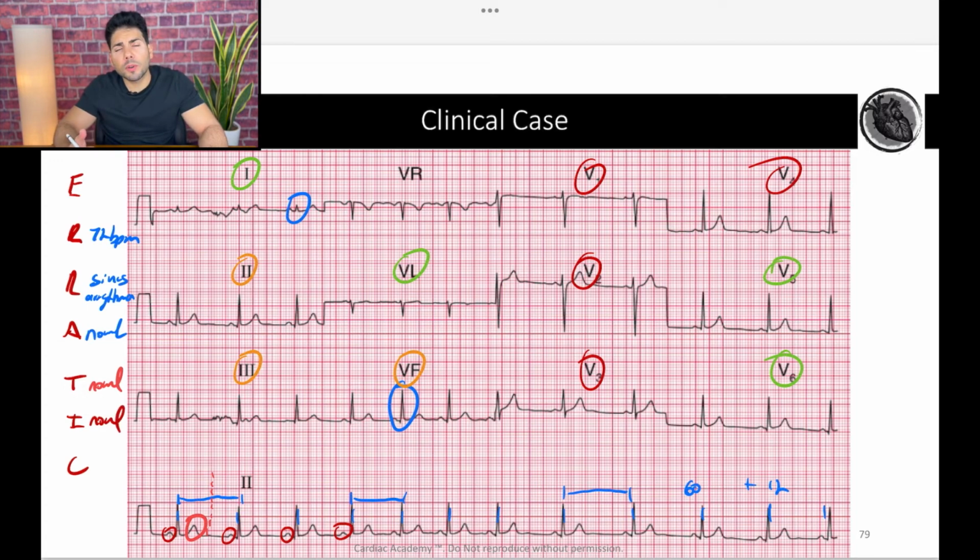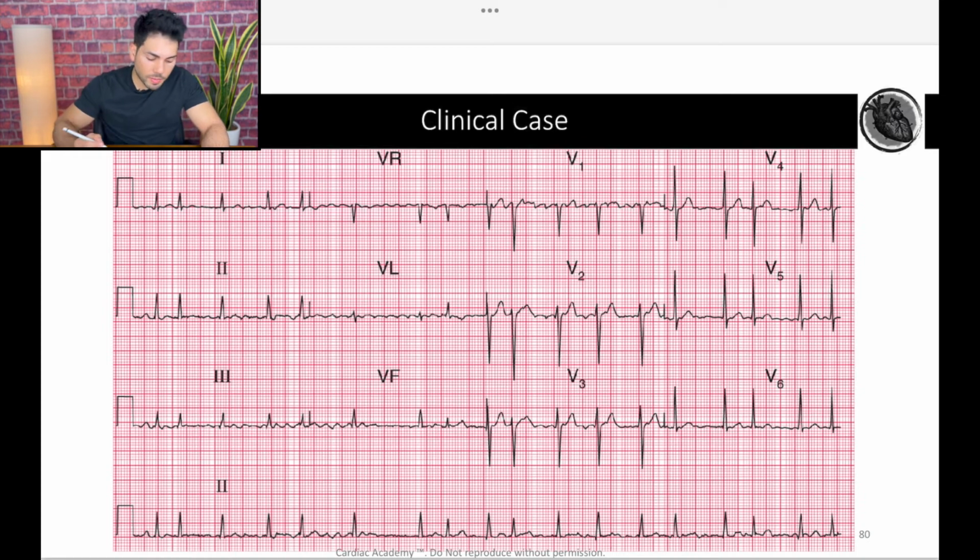And finally, chambers. We look for either left ventricular hypertrophy or right ventricular hypertrophy. And again, we're going to be discussing this in a future video, but for left ventricular hypertrophy, we'll look for the Sokolow-Lyon criteria or for Cornell's criteria. And they are not meeting the criteria in this EKG for left ventricular hypertrophy, so that will be negative. And in right ventricular hypertrophy, the most common finding is a right axis deviation, which we don't have here. So here is normal. So in conclusion, we have sinus arrhythmia with a rate of 72 beats per minute. Okay, very good. Okay, next EKG. Again, let's follow our mnemonic.